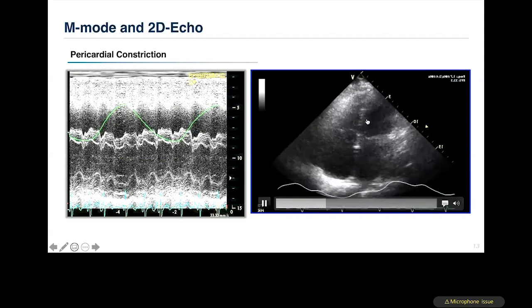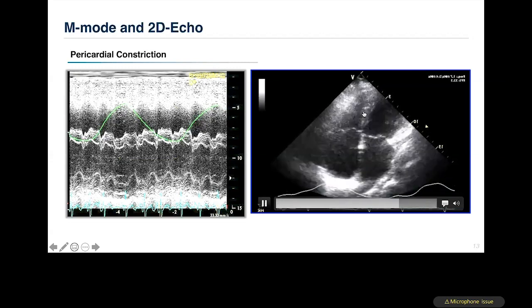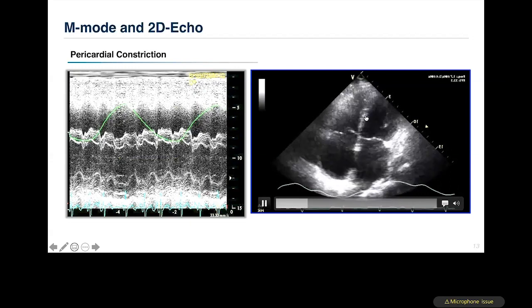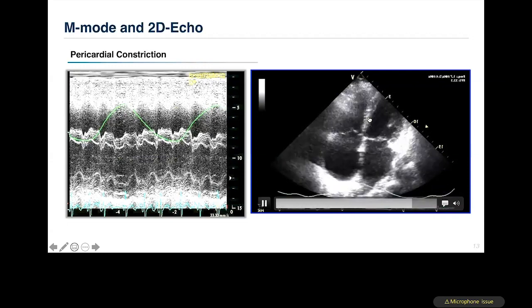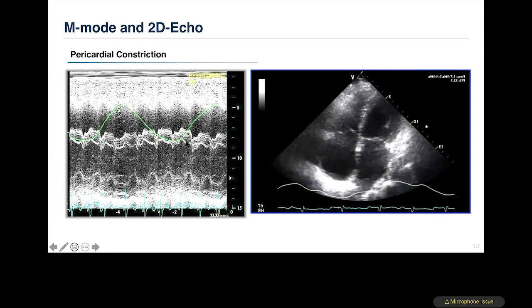This is the septum. You can see during the respiratory cycles it's moving back and forth. Plus, in addition, there is a very high frequency, intermittent or shudder-like movement that is happening during each and every cardiac cycle, which is of course much better recognized during M mode echo.